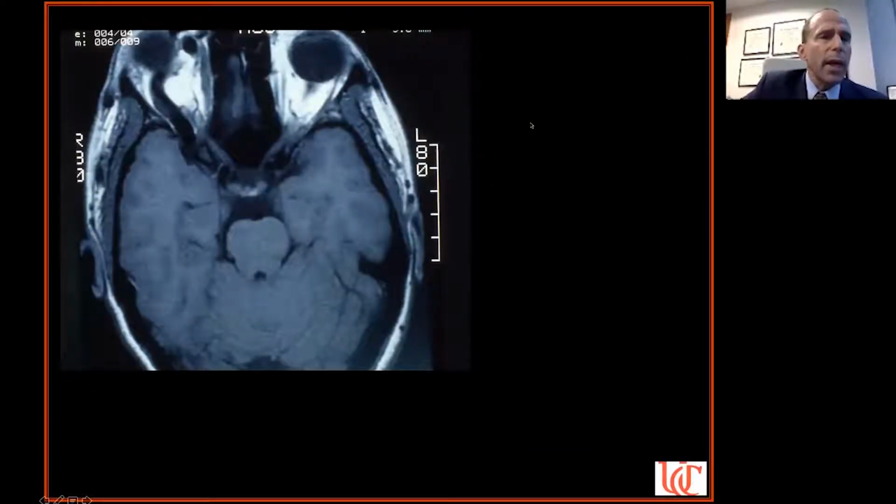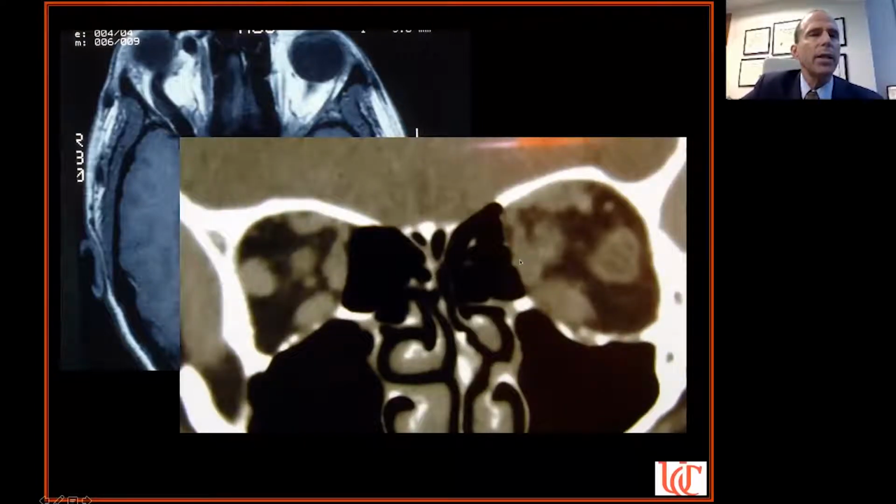This is a patient with a cavernous sinus fistula. Here is this huge superior ophthalmic vein. Here's the normal size over here. So this patient has a cavernous sinus fistula where the blood flow on the venous side is under high pressure, and it's distended this vein, and the blood is actually flowing this direction as opposed to this direction back into the cavernous sinus.